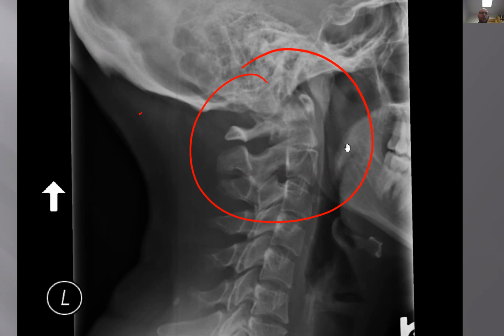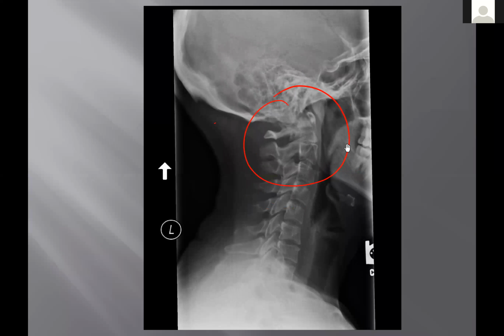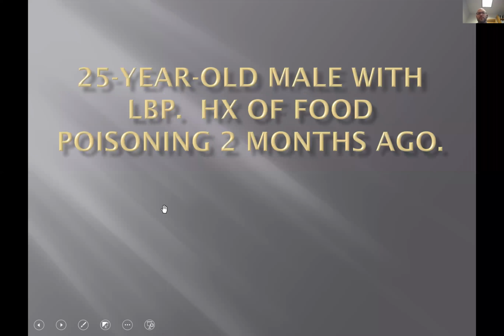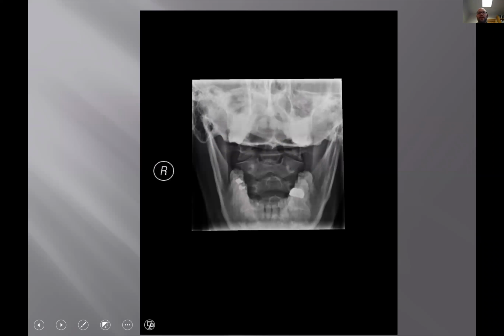All right. So what view are you dying to see here? AP open mouth. Right. Good. I'm dying to see it too. So let's show you. Whoops. Isn't that the weirdest thing you've seen since breakfast?